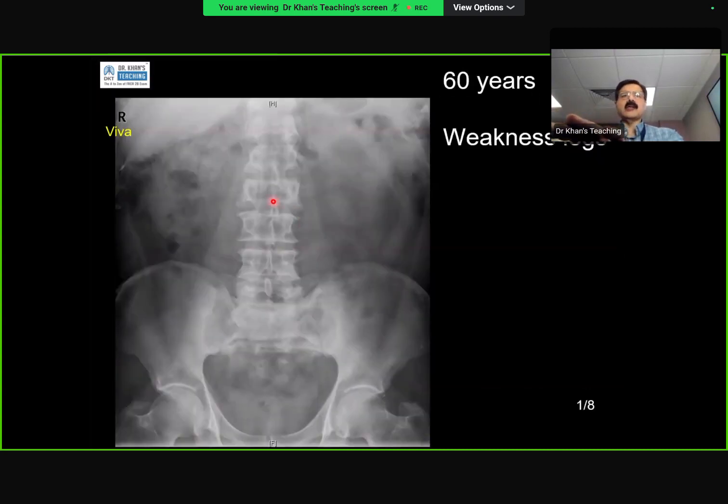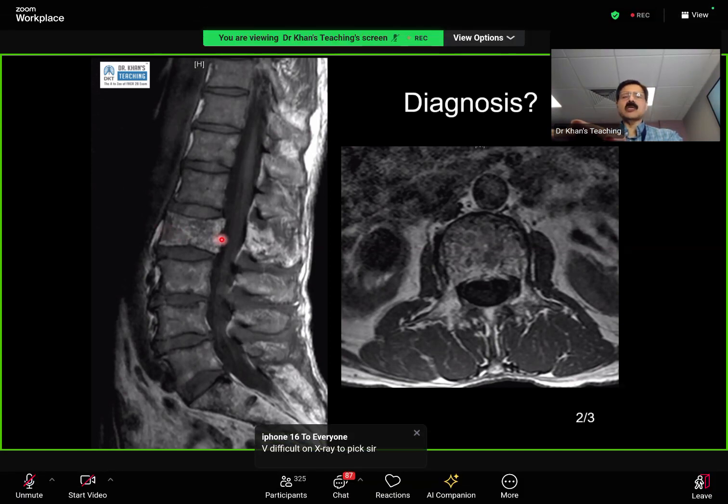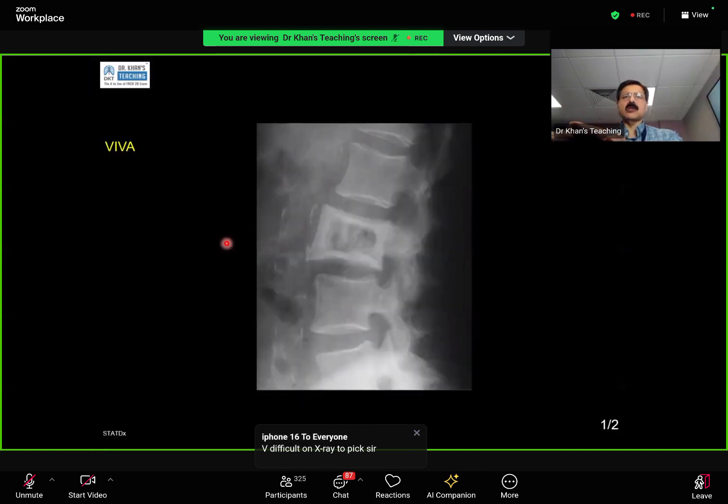If you see here, look at the mediolateral dimension. It is slightly bigger. It is a subtle finding, where just from here to here versus from here to here, you will agree that this is more. But here that is confirmed. Now the marrow is normal, and you did well where you just described it. Low T1 is bad. This is high T1, which is good marrow. So the finding is just that this is Paget's disease. End of story.